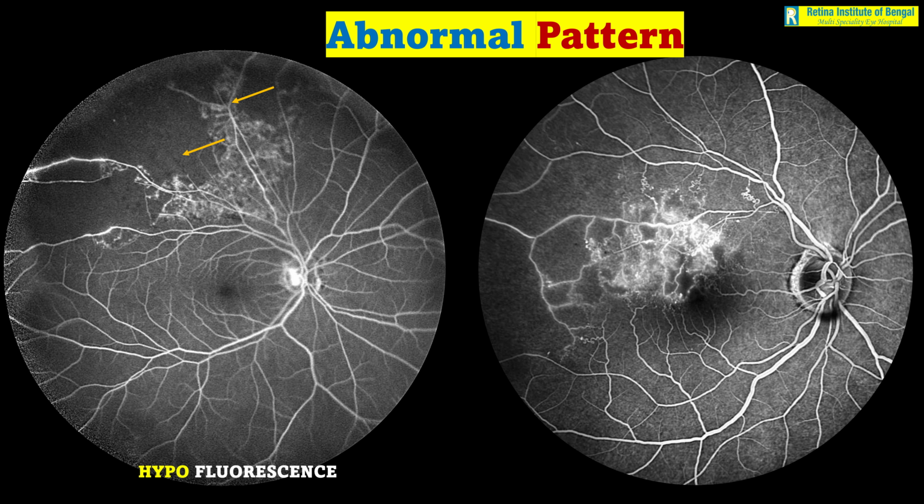And the other possible abnormality is what we call hyperfluorescence, where you see this area where it is intensely white. Normal whiteness around the macular area is something like this, but you can make out that this is intensely white. Compare this macula with this macula. This is what we call hyperfluorescence. So hypo is when you see abnormal dark areas, hyper when you see abnormally white areas. Now let's understand what can cause such abnormal patterns.